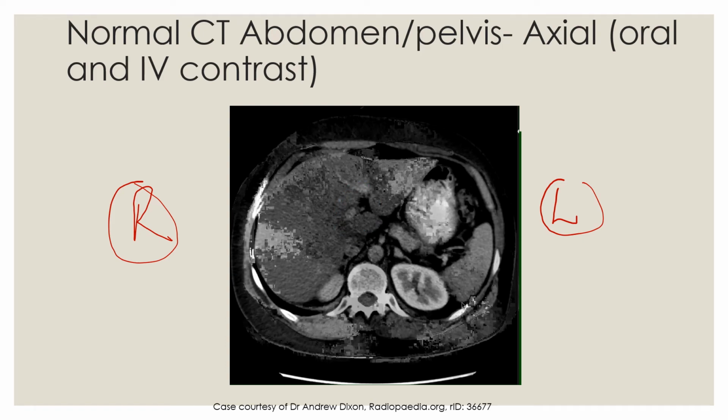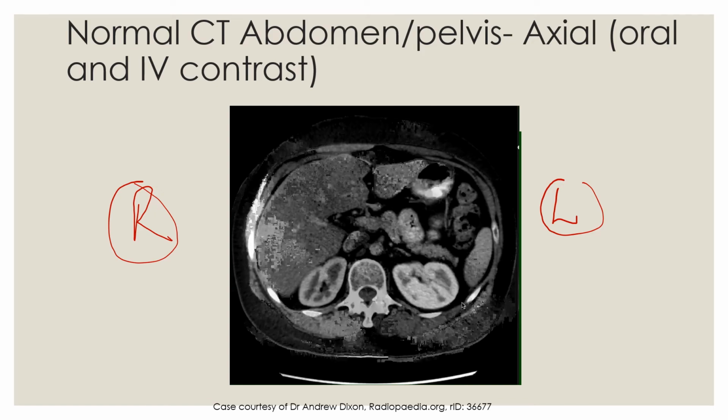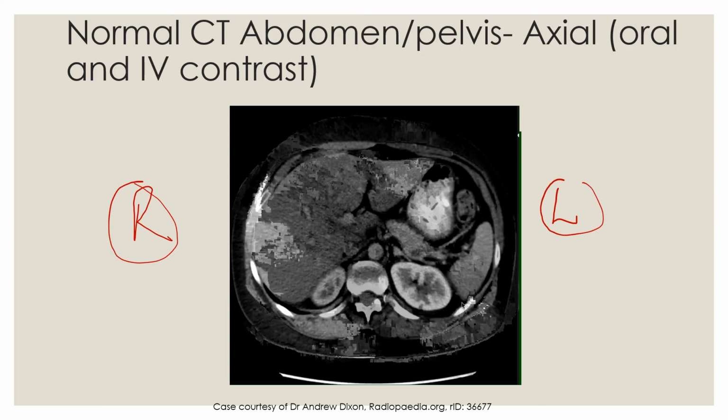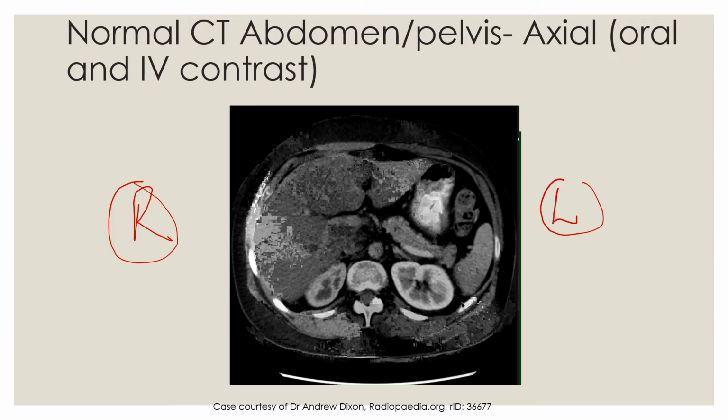I'm going to show you the normal pancreas now. So the pancreas will be around this area. Just keep your eye there. You'll see a soft tissue density structure, which is slightly grey, just coming in and out of view. So this is a nice representation of the pancreatic body and the pancreatic tail. You can see a vessel just posterior to the pancreas, and this is the splenic vein. As you can probably already appreciate, we get a lot of nice anatomical detail with CT.